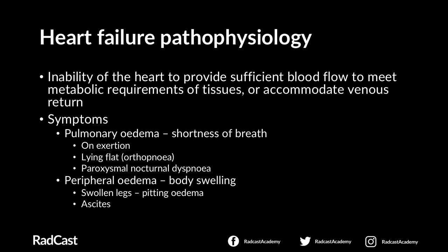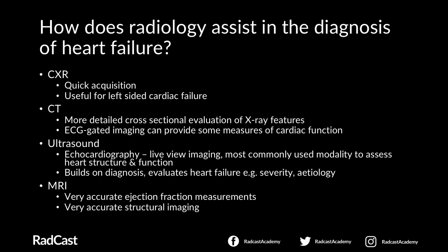peripheral tissues. Since we're looking into chest x-rays, they're not going to be very helpful for assessing peripheral edema, so we'll be focusing on how this resultant pulmonary edema and the lung changes that we see because of this can be identified. So, we're soon going to delve into how the chest x-ray can help us identify heart failure presentation, but I'll just outline some other main radiological modalities that all play a role in the diagnosis and evaluation of heart failure. Obviously, the chest x-ray here, it's quick to acquire the image, and we'll go on to some of the hallmarks, obviously, to identify left-sided heart failure, which it's very useful for.